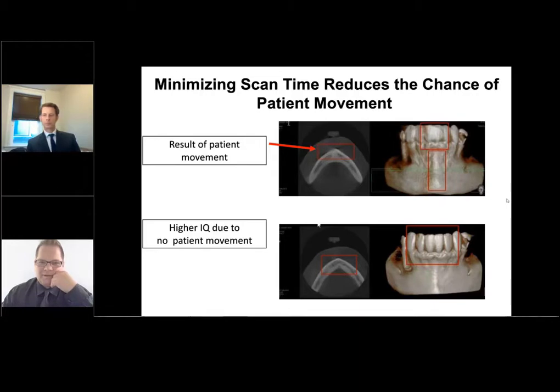Yeah, if you look at that 3D on top, you can see it's hilly and bumpy. That's from movement. It's almost like you took a rag and wiped it. It causes that mushy, hilly effect. So the bottom image is much clearer.